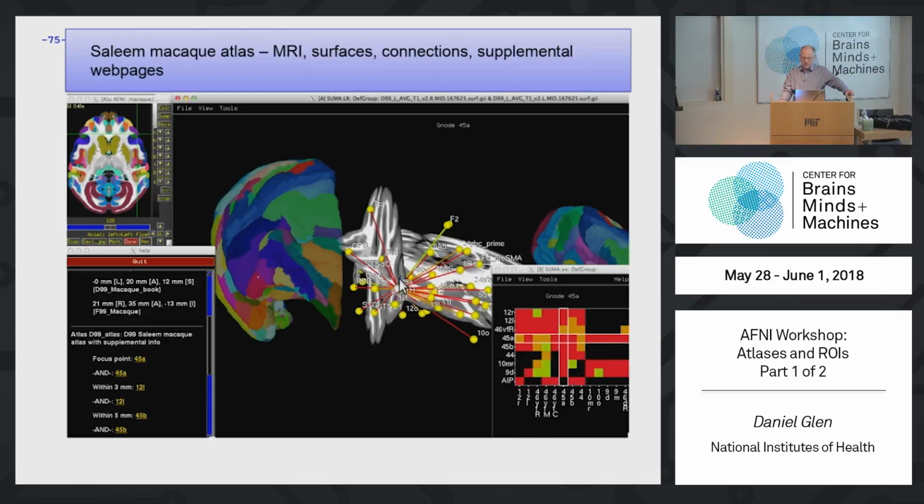And these two talk together, and they also talk to AFNI. This is inside SUMA, which we will show you tomorrow. So that's a really nice atlas. Saleem has put a lot of work into that, drawing all the regions and making sure it matches the paper version of the atlas too. We also provide coordinate transformation so that you can know where to look in the atlas too.